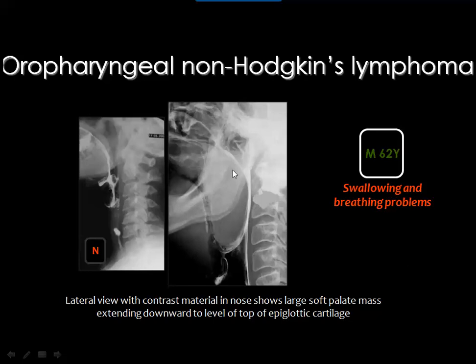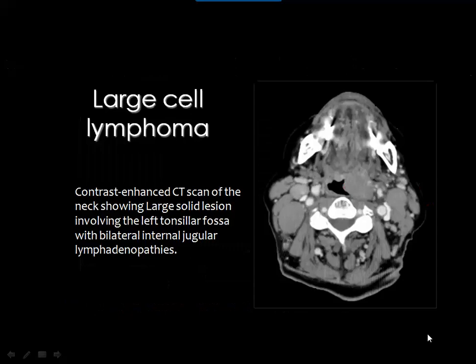In here you can see by this barium swallow there is marked stretching of the barium column over a very big mass here, affecting the region of the base of the tongue and the oral cavity. And you can compare this appearance with the normal configuration. This is the vallecula and this is the piriform sinus, which is markedly involved by the tumor.